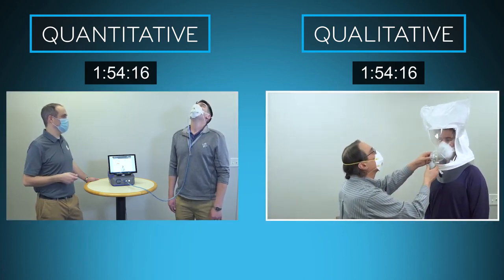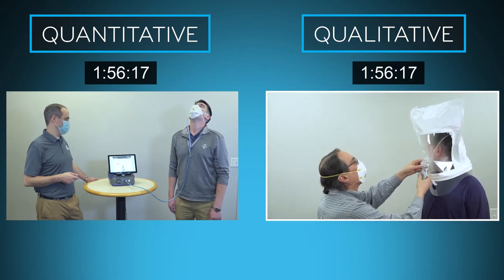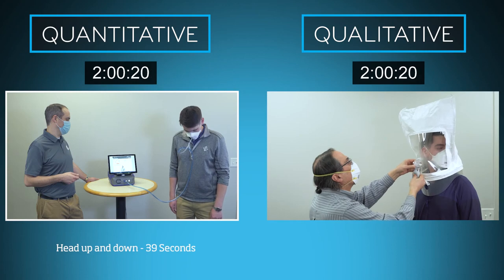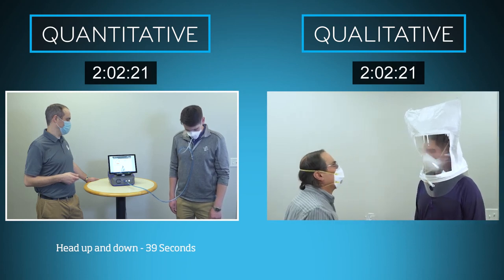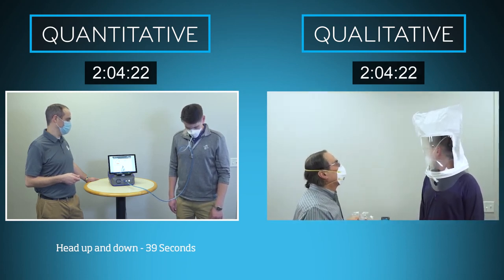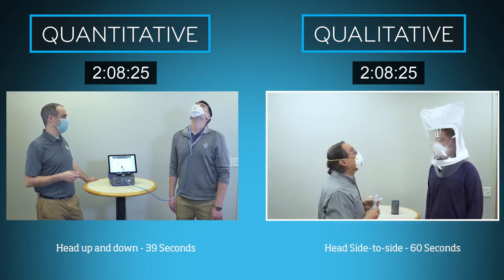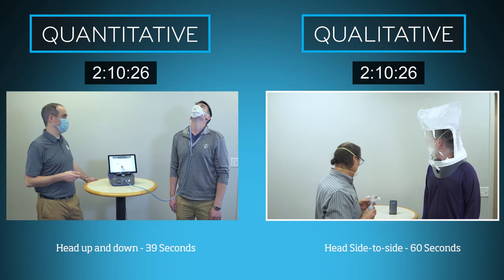With the qualitative fit test still completing exercise 2, the quantitative fit test moves on to the fourth and final exercise, 39 seconds of head up and down with 2 breaths at each extreme. Now the qualitative test moves into exercise 3, 60 seconds of moving the head side to side.